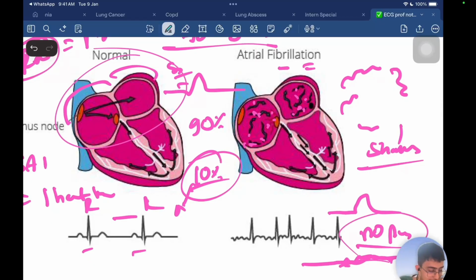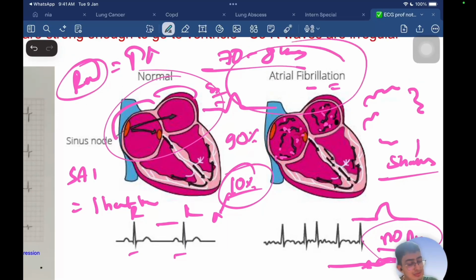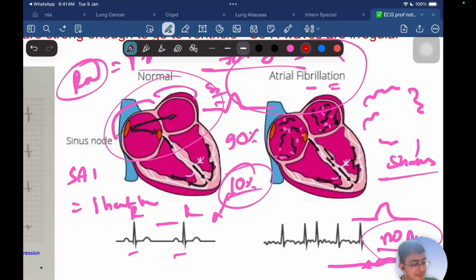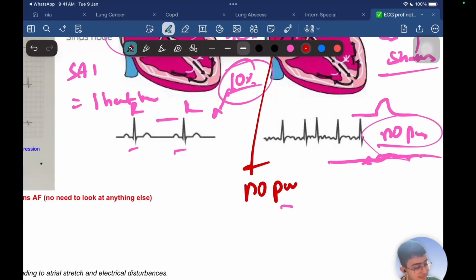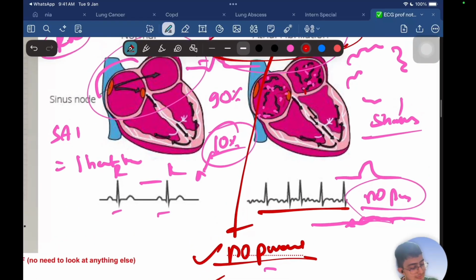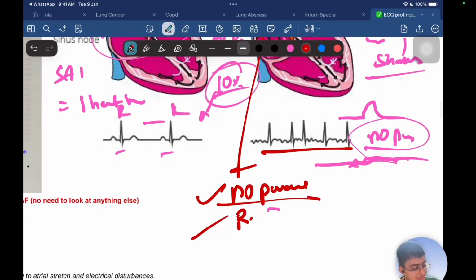Okay. So in an atrial fibrillation ECG, what are the findings you might be expecting? The rhythm: there is no P wave, and the ventricular depolarization is irregular. Very good. That means the QRS complex is irregular. This means the rhythm is irregular. Right? So you can now explain.